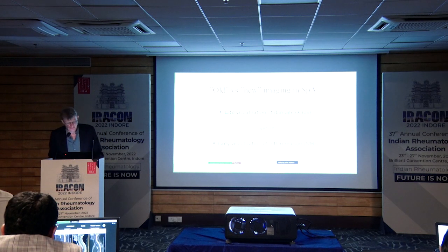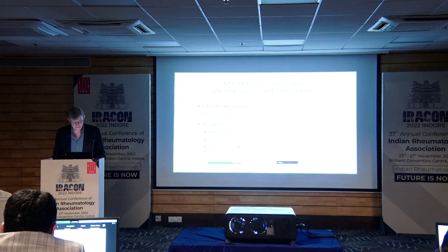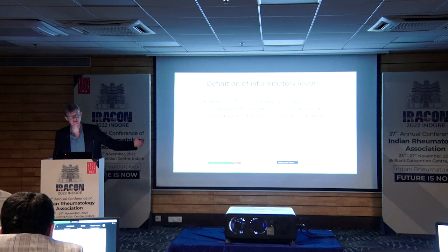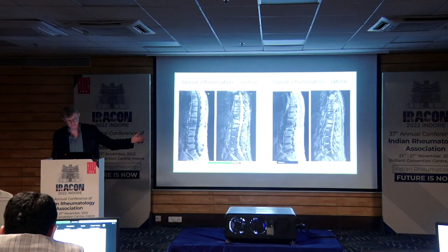So again, the main advantage is that we can look at inflammation. I have shown you exactly the same slide previously, but this is the same thing we look for here. Inflammatory lesions. Well, bright signal on the STIR sequence. The same thing as before.